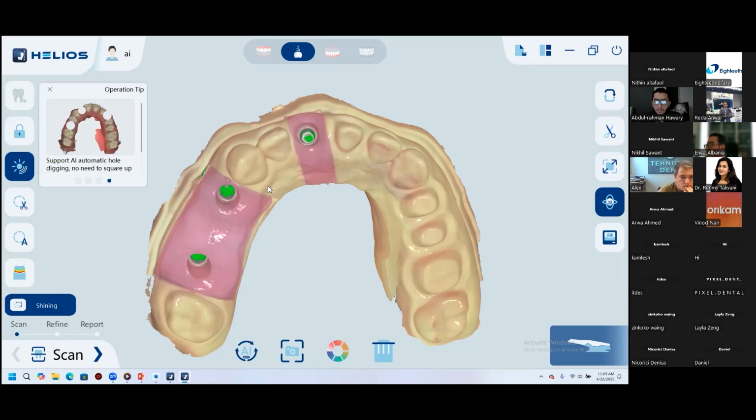Doctor, I have a question. Go ahead. Can you please show us the ortho simulation procedure? Yes, sure.